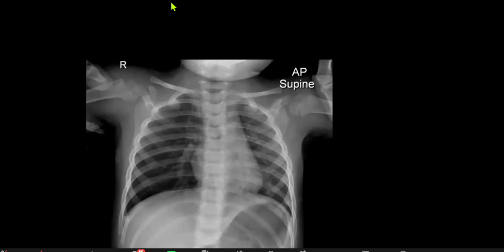So this is a frontal chest radiograph of a child. The most obvious abnormality is expansion of the right hemithorax, which also appears to be translucent. My first differential would be a foreign body inhalation on the right-hand side. Other differentials to consider would include Swyer-James syndrome or Poland syndrome. I would correlate with the history, and if there is concern for foreign body inhalation, recommend fluoroscopy or expiratory radiographs.